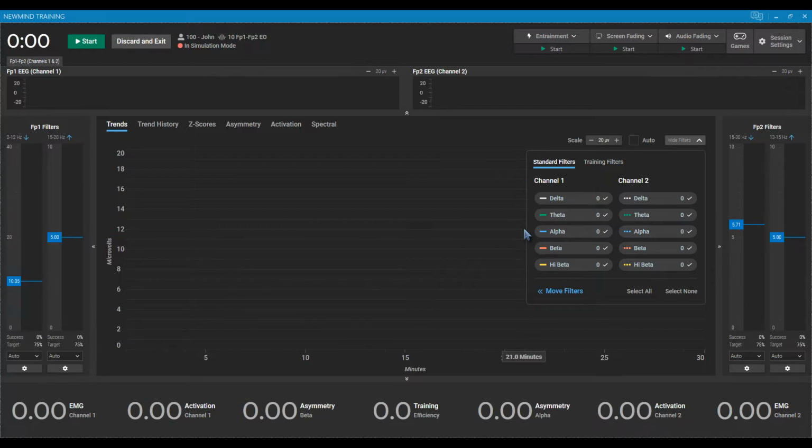Just so you know, there are other colors of Photic. You can do blues. Blues offer a calming effect to your clients. Reds are more emotionally related. Greens are a nice neutral in between, a balance between blue and yellow. Yellow is a very excitatory color. It's generally not a color I would recommend using with clients, so I would urge everyone to stay away from yellow for the most part.